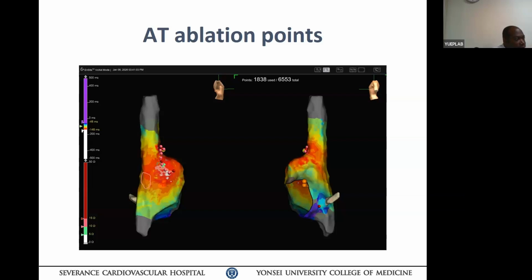Normally, you can have two sinus rhythm activation sites, one a little bit lower along the crista, the other higher. If you don't have a catecholamine drive, you're not going to be able to find the true sinus node of rapidly firing function. So we use isoproterenol, create a good sinus node map, then based on that map, you map the tachycardia. Make sure the tachycardia focus is different. If not, you have sinus node reentry, and then you need to do differential maneuvers from there. So this is the important part of your work, okay?